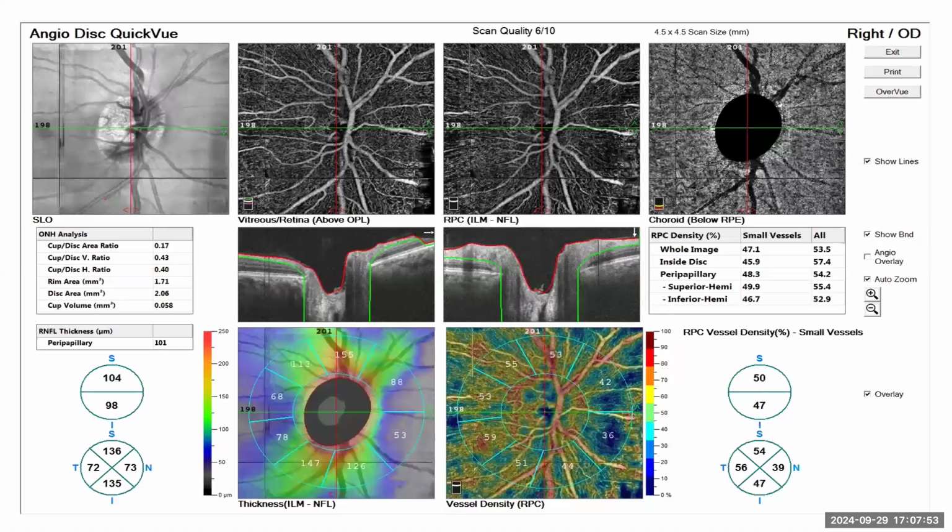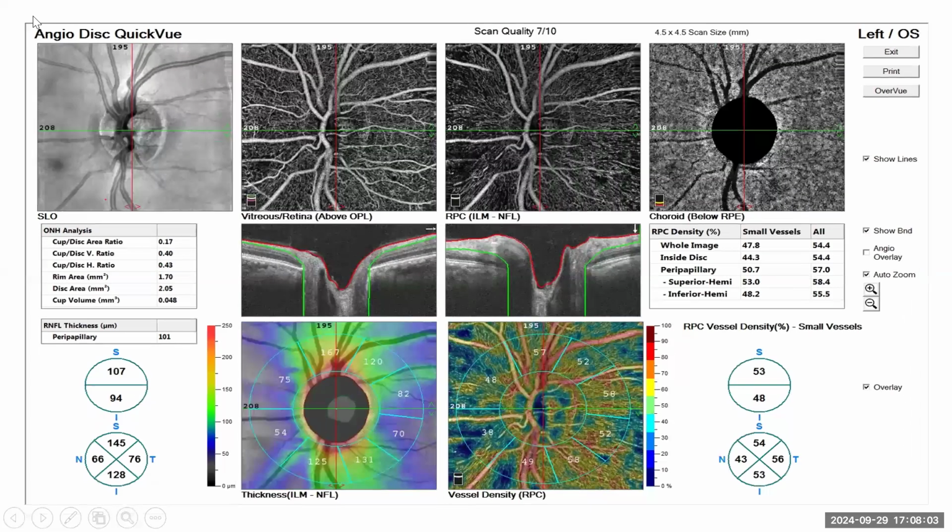So this is the vessel density for this. This blocks my view. Okay, this is the vessel density for us to look at. How do I remove this? The control panel on top is actually blocking my view for the upper part of this. How do I take this out? Okay.